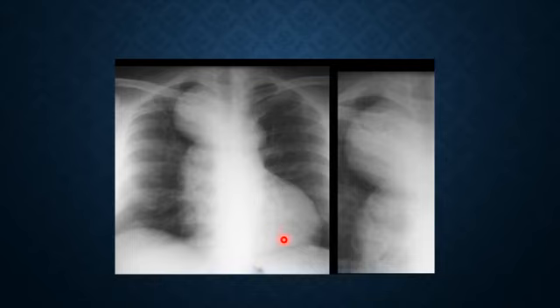Again, what do you think? Again, it is well defined here, very well defined. Okay? So it goes with a posterior or middle mass.